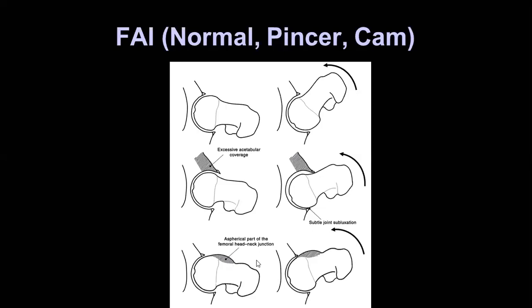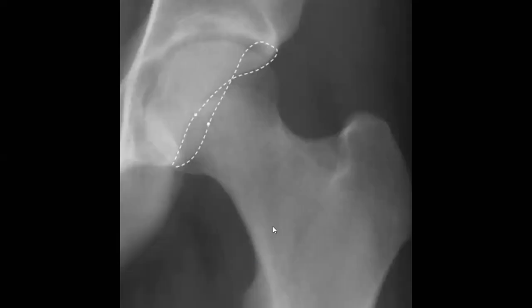Okay. Sometimes in the exam they can show you an old-age patient with osteoarthritis, and this is more difficult. So post impingement, what happened? The osteoarthritis happened. In this case it will be more difficult because you will think just about osteoarthritis, but you will not think about the cause of osteoarthritis, which is the impingement.